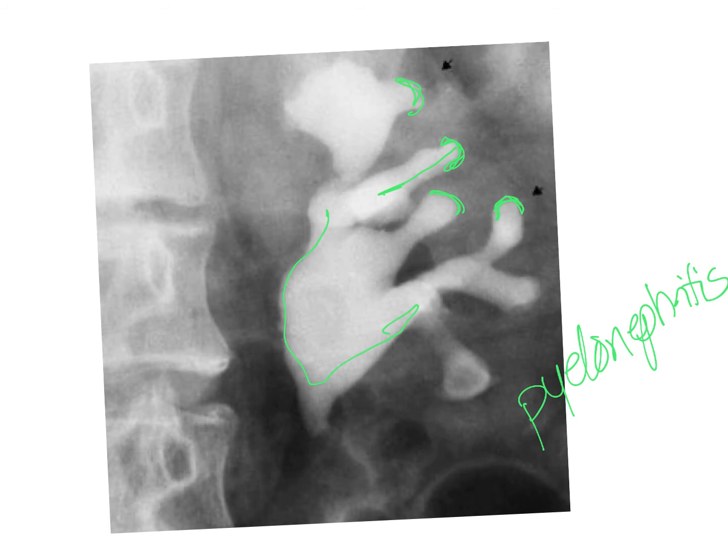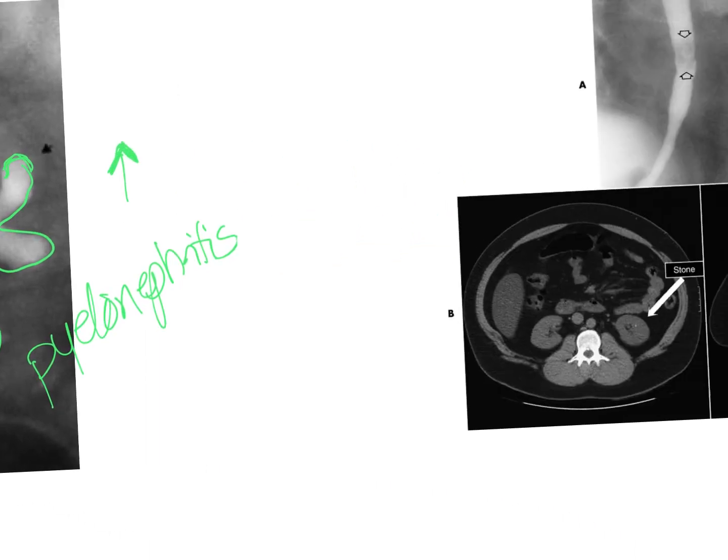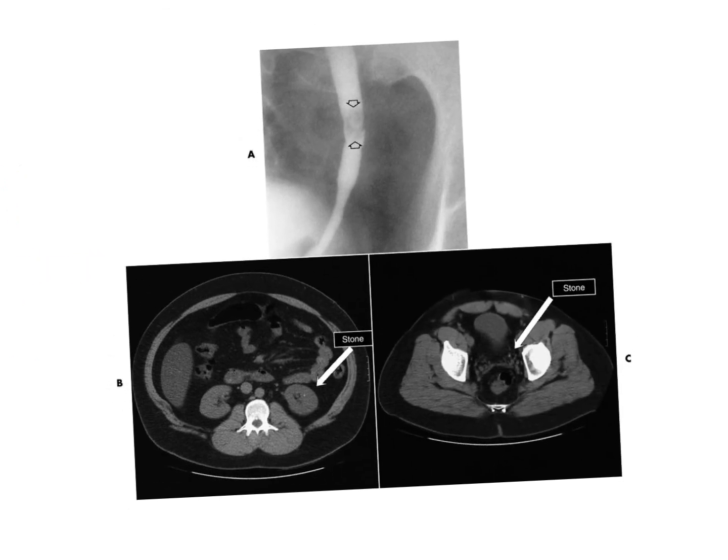Excuse me. This is an x-ray of a patient who's had contrast injected. That's what this bright part is. In general, even though this is kind of an additive disease a little bit, the very fact that we are using contrast to highlight this disease, we need to go up a little bit in kVp, just because that contrast is there in general.